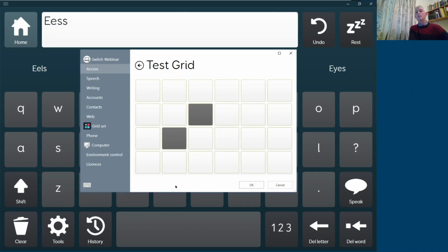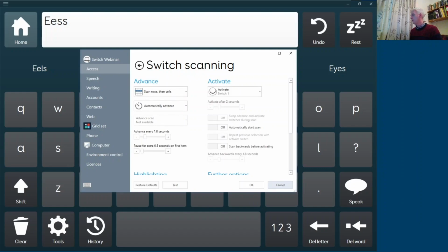Okay. So that option can also be applied to a long hold that we explored earlier and can be quite a useful thing. A long hold to say, just reverse up for a minute.